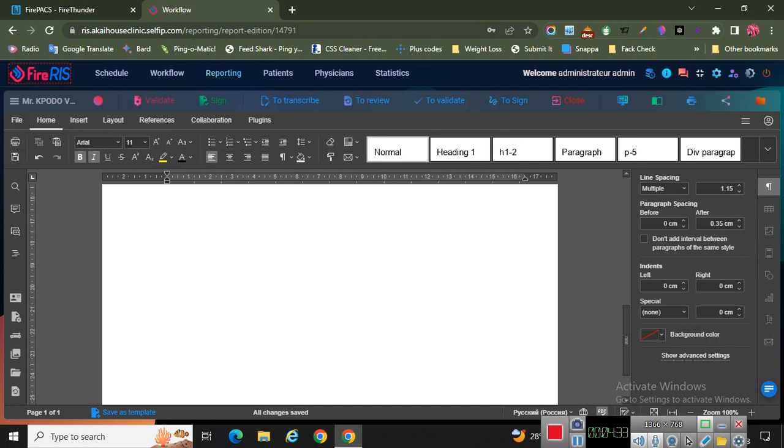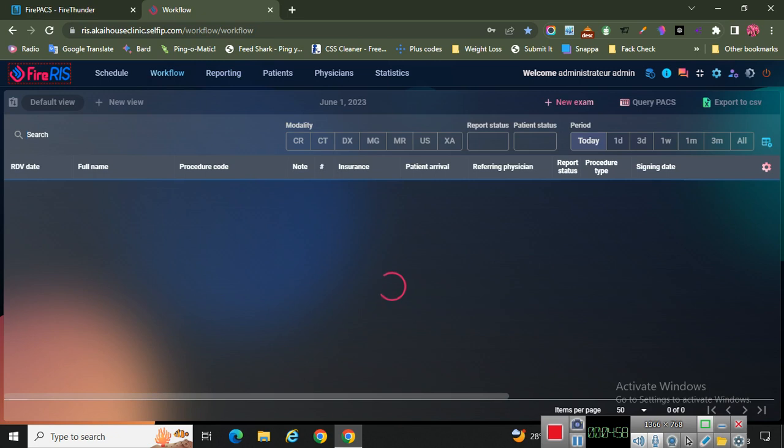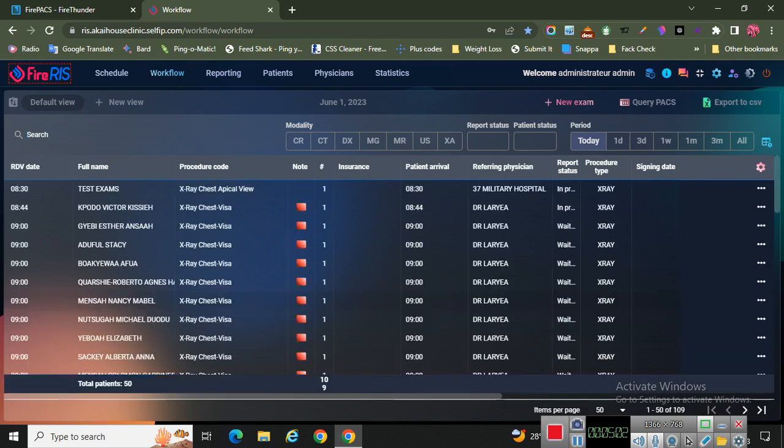If, for example, you want to have a look at a request form, for those examinations that are not obviously medical exams, we will do our best to upload the request here so you can see here and just click on it. Let me just do a demo. Let me go back and pick an examination that is not a medical.